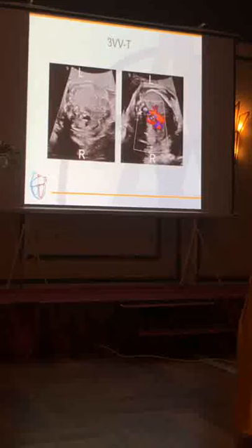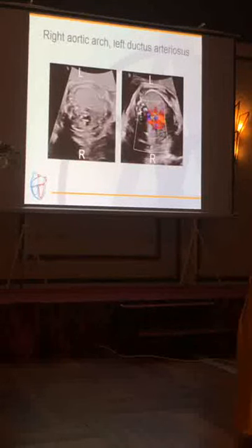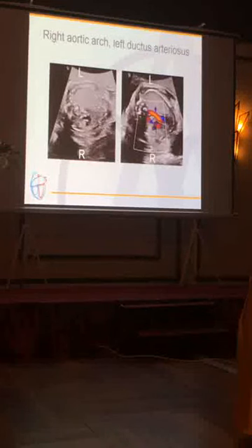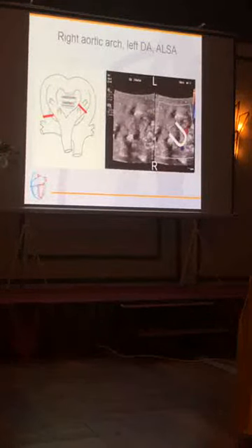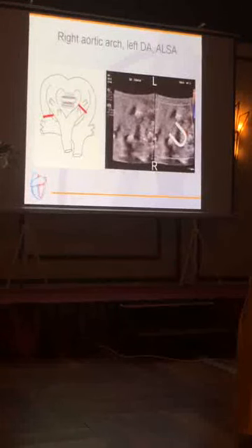This will be presented a bit later, again the same, but with a description. What is typical for cases like this is that first the vessels show something like the letter U, so some people say you can see the U letter in the mediastinum.